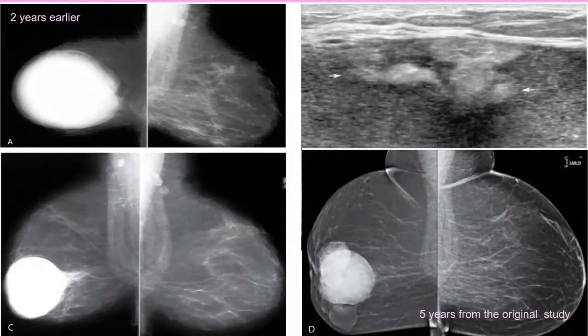What could it be? History, trauma. Excellent, well done. Yes, it is a hematoma, because it was acutely following trauma. The hematoma persists, just regressing in size, and is complicated by adjacent fat necrosis.